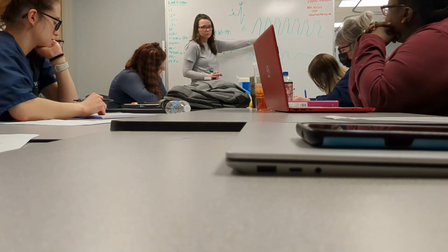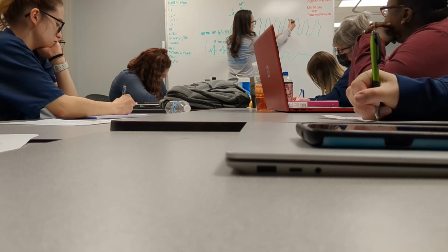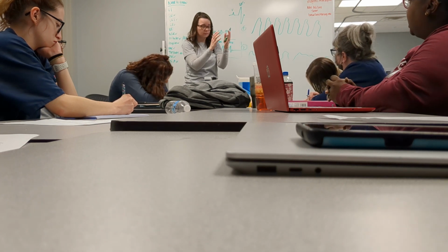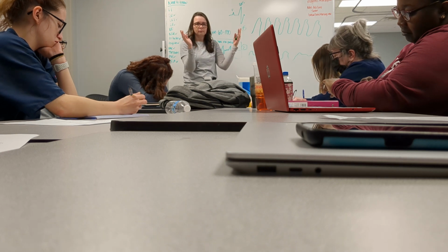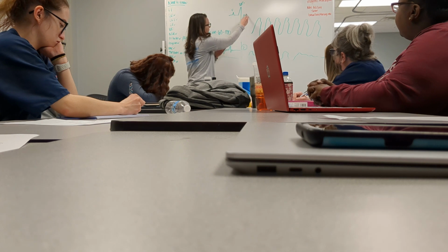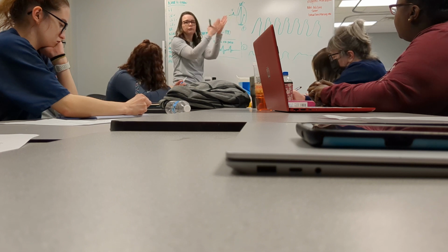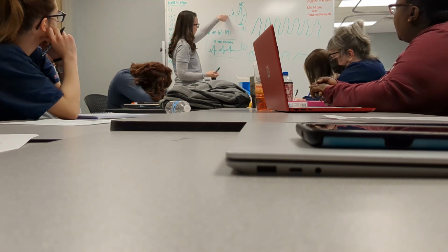This looks like tombstones, right? Kind of. See how it's organized? Think of this like ventricular, so the bottom of the heart, the bottom ventricle, that left ventricle of the heart. Remember how we talked about the left ventricle, the bottom ventricle is this big impulse right here? That is essentially the big impulse of your heart. Real fast. And it's so fast that all of this is buried.